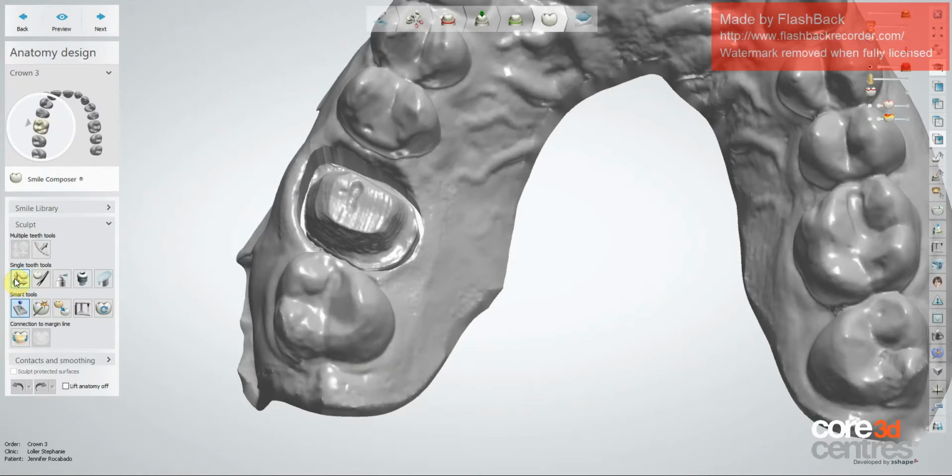This kind of tooth right here, single posterior, can be done in about 3.5 minutes. It could even go faster if the software allowed it, but the software is a little slow. I've got my computer souped up, but there's just some things that the software can't go any faster at. So I'm going to walk you through how I design, and then I'm going to do a second video of me literally designing at full speed.